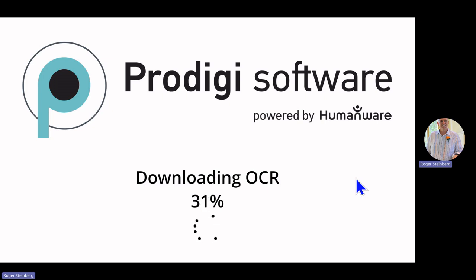I'm going to let this run. We'll probably cut a little bit out of the video here, but it should take less than 2 minutes.